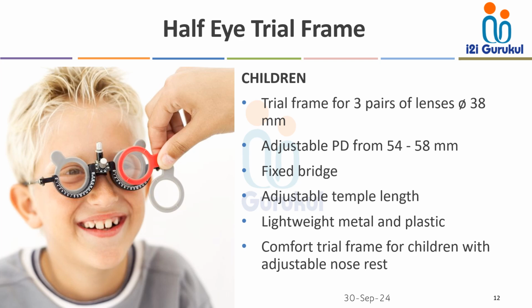The comfort trial frame for children with the adjustable nose rest. So this is the ideal option for children.